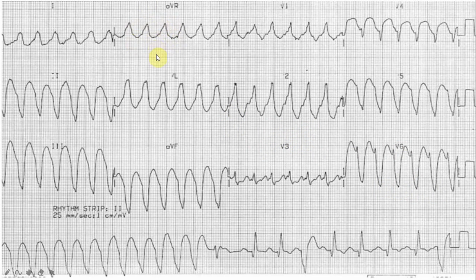If we follow the Brugada criteria, the very first step is absence of RS wave in the precordial leads. This feature is not fulfilled in this ECG. Therefore, we can go to the second step, which is the Brugada sign. The Brugada sign is the distance between the beginning of the R wave and the nadir of the S wave being more than 100 milliseconds. This is equal to 2.5 small squares.